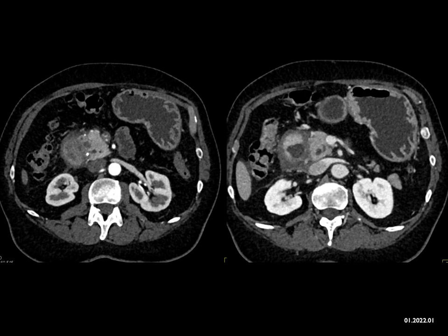And then if you look at the image on your right a little bit more carefully, there seems to be an interface, low density, between the duodenum, which is edematous, and the pancreatic head, which is also edematous. We don't see any dilated ducts, but we don't have all the images. The vessels, as we see them, look okay. There's no bowel obstruction. So what are we dealing with?